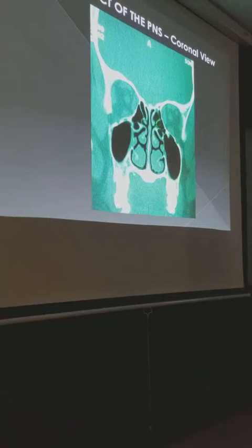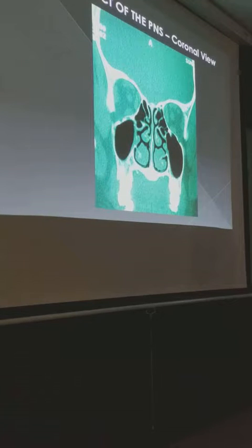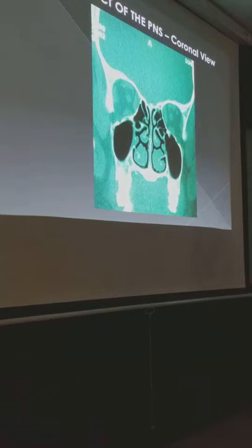If you look at the orientation of your middle turbinate right here, where is it going? What shape does it want to make? It's just pneumatized. But what is the direction of its position? Is it like this? Like this? Or like this? What do you call that direction? Horizontal, right? So you know, roughly, you're already in the posterior third.